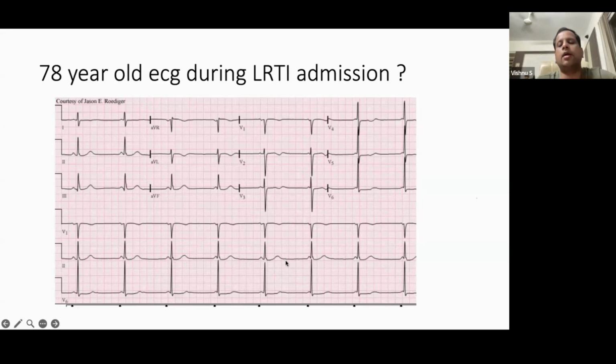This is also a pre-runner of sick sinus syndrome. So this P wave is not producing this QRS. This is from the junction firing. This is from the SA nodal firing. So this is independent. Atria are firing independently, ventricle is firing independently.